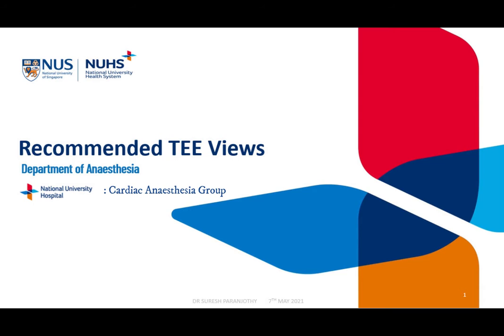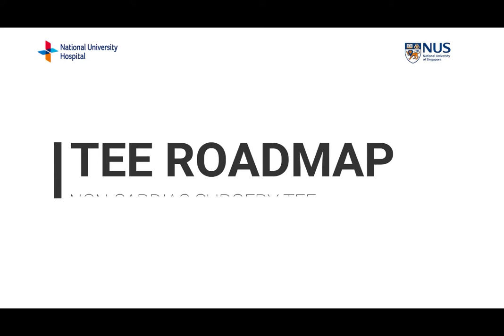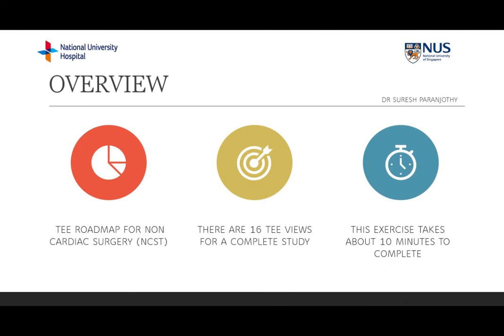Perioperative Echocardiography Training Program. Module 1. This module will take you through the recommended TEE views for non-cardiac surgery. There are 16 views to learn, obtained from the mid-esophageal, transgastric, and deep transgastric planes.